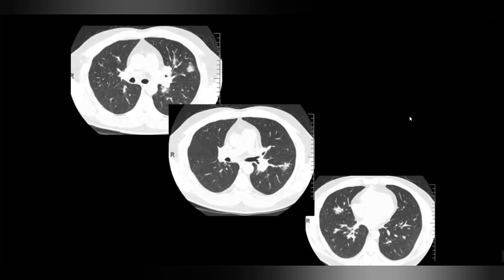Okay. Now the patient had a bronchoscopy and they found a lot of hemorrhagic spots in the bronchi. Then I would like to go for the bronchoscopic biopsy at the same time. Yeah, but before that, if you see these hemorrhagic foci within the bronchi, then out of these differential diagnoses, what is the most likely diagnosis? I think fungal infection is the most appropriate one. Kaposi sarcoma, because Kaposi sarcoma is a vascular tumor. So when they do bronchoscopy, they will see a lot of hemorrhagic foci within the bronchial system. Okay. So this was a case of Kaposi sarcoma.